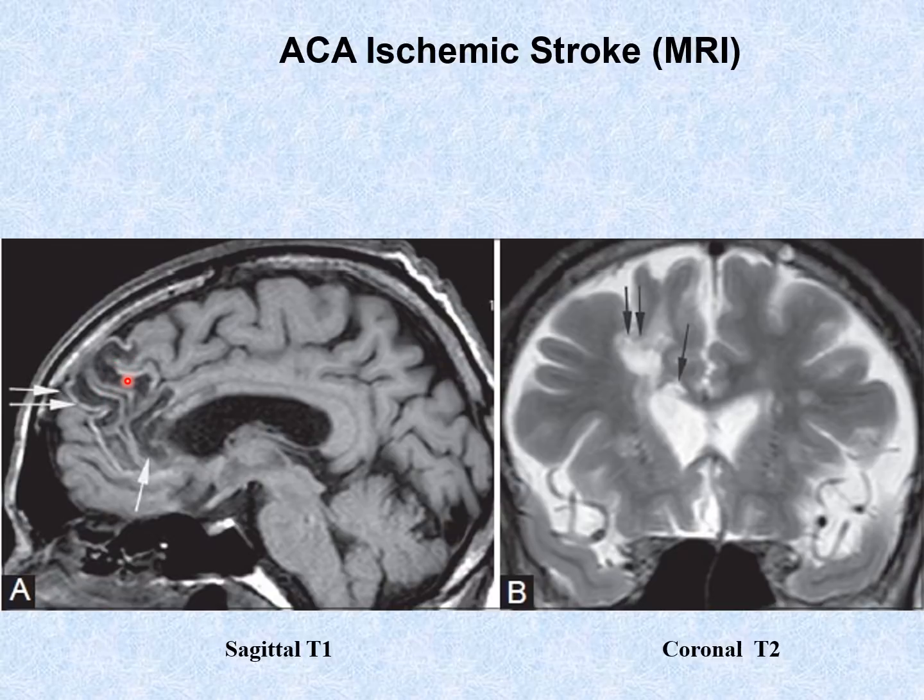And on the MRI, you see a very fine resolution of cortical structure and subcortical structure. But on the T2 weighted image, we can appreciate the level of inflammation as well in the stroke area.